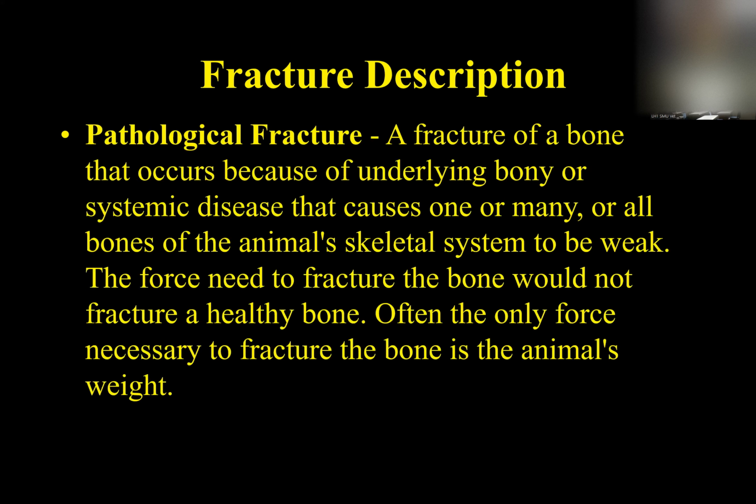A pathologic fracture. What is a pathologic fracture? This is a fracture that happens to a bone not due to trauma typically, but due to underlying diseased bone. So if you have an osteosarcoma or a severe infection of a part of the bone, and that bone becomes very weak because there's lots of lysis going on due to the tumor or the infection, sometimes a dog will fracture that just walking across the room.